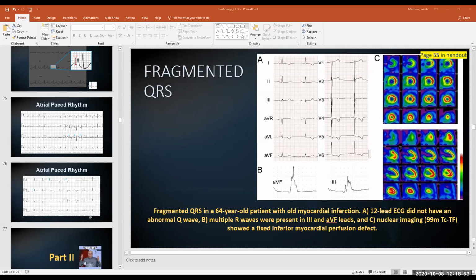So this was an actual case I found in a patient. I put this on page 55, at least I said I did, of your handout. And we have a nuclear study on the right side, which I think I actually got to in our cardiac diagnostic testing PowerPoint, which I will finish, by the way. What we saw on the EKG on this patient was that it looks like they had something here, maybe as well here, and as well in aVF.